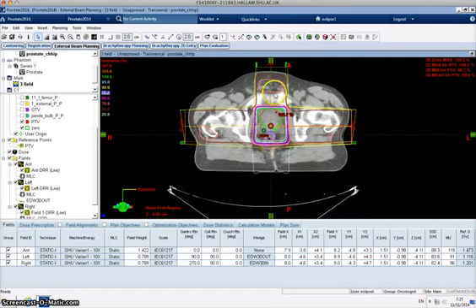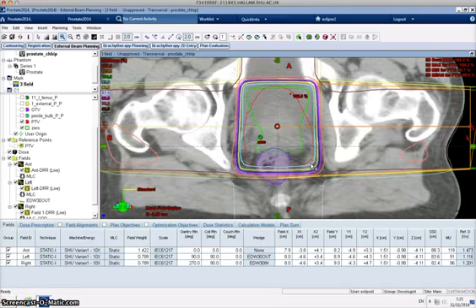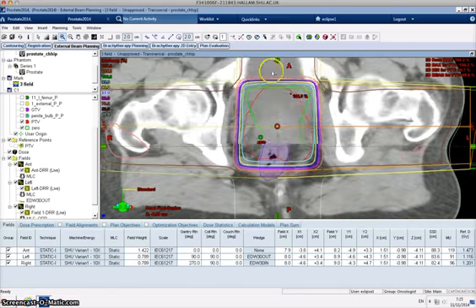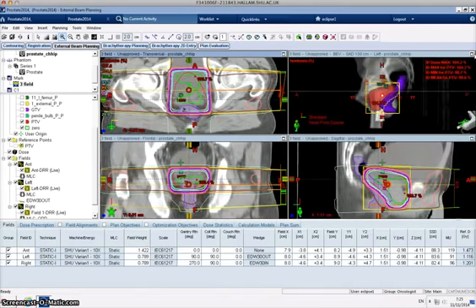Clearly you're going to have 4 fields going on, so you will have something different going on down here to what I've got. So we need to review the isodoses and eyeball them. I would zoom into places, so get an overview of the whole patient, and then maybe zoom in around your PTV, and then you're able to get a better view, and we can see where it's conforming well and maybe not so well. And then I'd again encourage you to take some screen dumps of these as you do them to help you with your assignment.